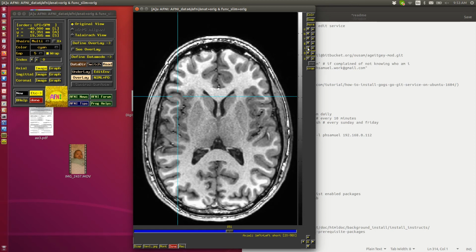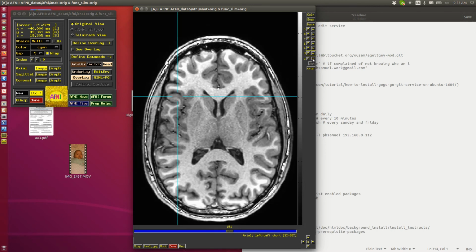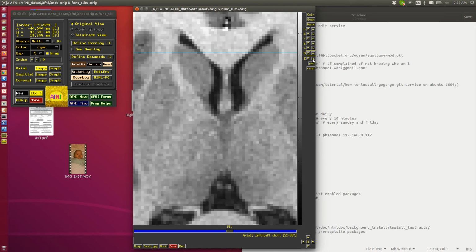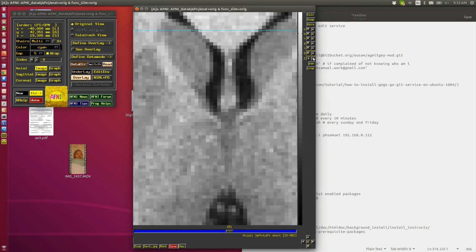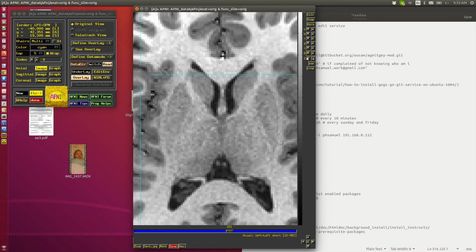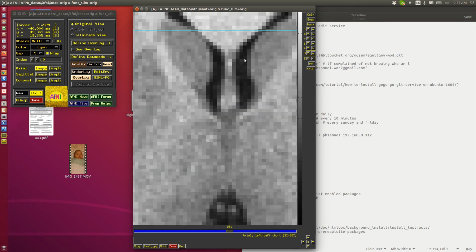Then, how would you zoom? Yeah, Z, I think, is pretty self-explanatory. Z. Zoom. That's a zoom of factor 2, a factor 3, and a factor 4. Those are built in. There's no continuous zoom, besides these four levels.